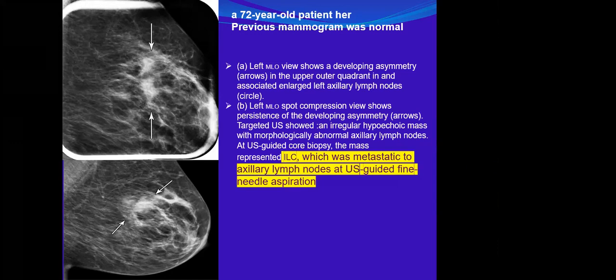It is hard. Excellent. What does it mean, being hard? It is fixed to surrounding structures. Yeah, excellent. Why is it fixed?